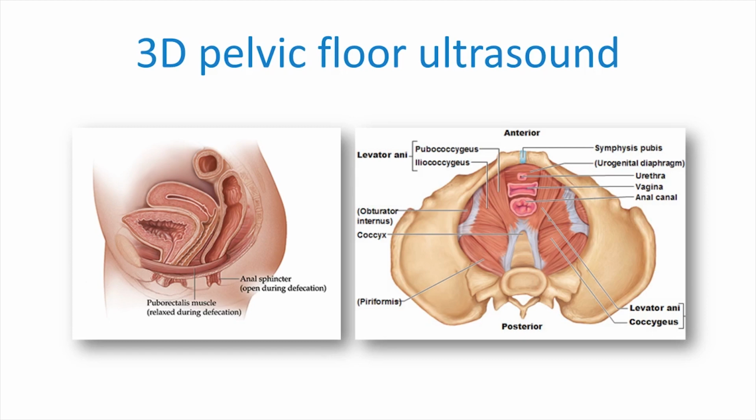This is a talk on a new ultrasound technique in women's health, which is the ultrasound assessment of the pelvic floor. The concept of pelvic floor ultrasound is that it allows us to look inside the pelvis and the region of the pelvic floor, and look at the relationship of the pelvic organs to the pelvic floor, and also look at the structure and function of the pelvic floor.